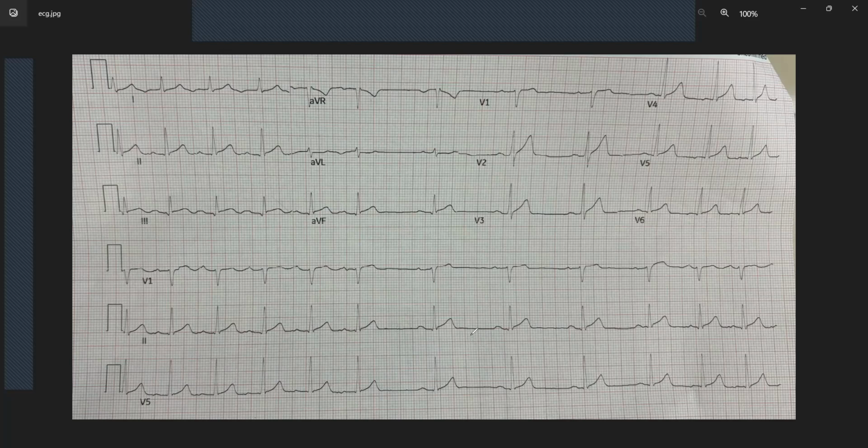We need to look for a P wave. We don't really see it, but it may also be because of the orientation of the leads around there. So it could be a bit of sinus arrhythmia, but what's making me think against that is the definite elongation and then the sudden decrease after that. So there could be just an orientation of the leads that's leading to us not seeing another P wave somewhere along here. All right, so that's one of the things that we picked up.